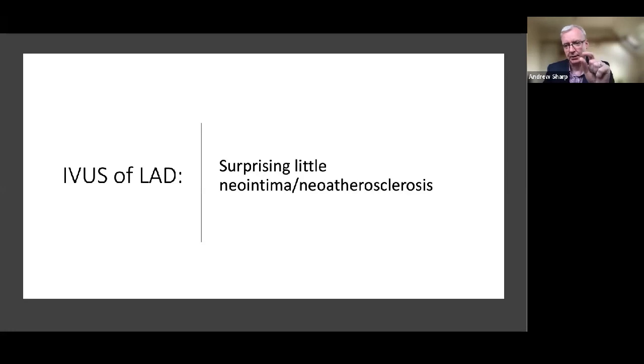That is the point of the highest rupture risk of non-CTO PCI. It's because it's within that tapering zone, and it's on an angulation, and the distal edge may be going down intramyocardially, so you've got a hinge point. So if we haven't said it enough, IVUS your LADs, because you can't guess.